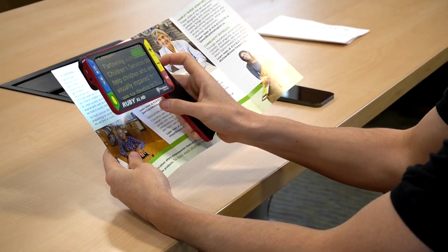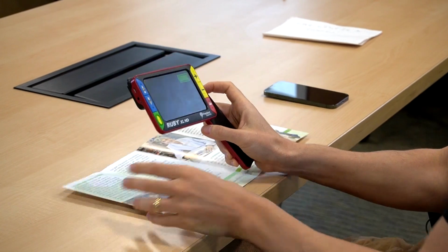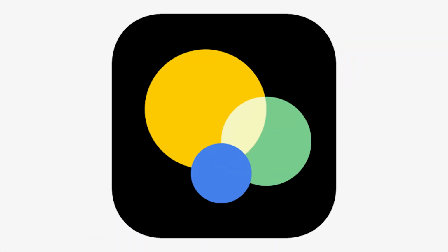This particular model even has a handle that can be folded out, and when we fold out the handle, now we can use it more like a regular magnifying glass and kind of just hold it up against our reading materials. But the important thing to note is that we do not have to do that. We can fold out the stand and just rest it on top of our reading materials, therefore allowing us to be hands-free.